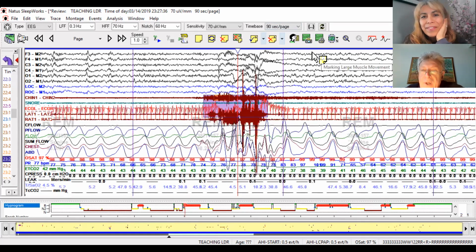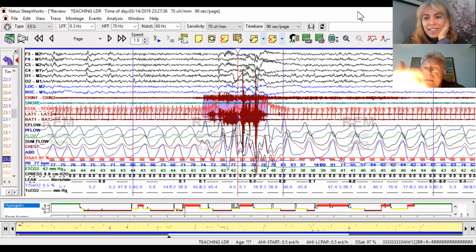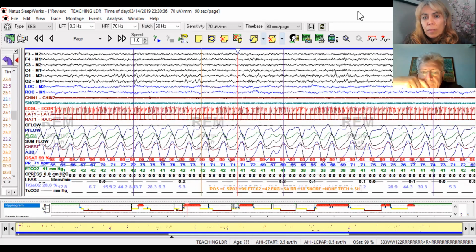But if it is only some episode during the whole REM sleep like this, it does not qualify for an abnormal REM sleep without atonia. And we've reviewed older studies in normal adult individuals, and movements occurred in REM. And as you say, it's the characterization of the movement, the duration, and the type of movement. But this repositioning does occur in REM in normal individuals as well.